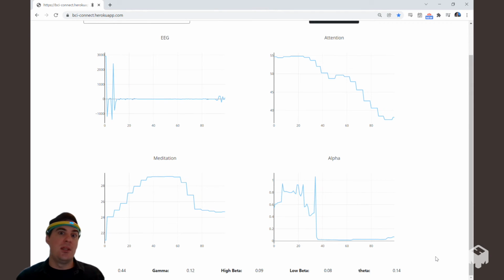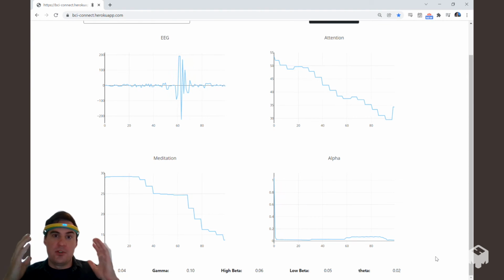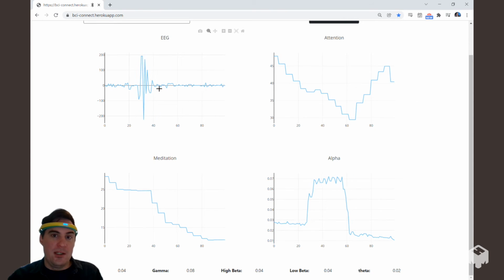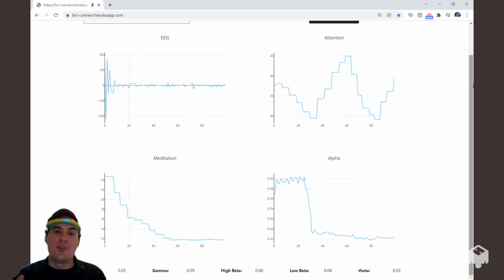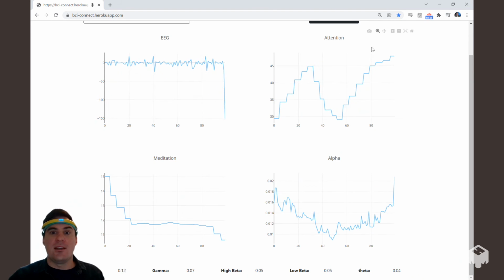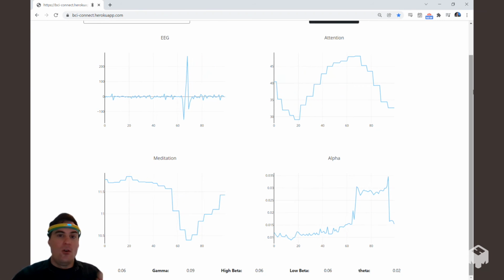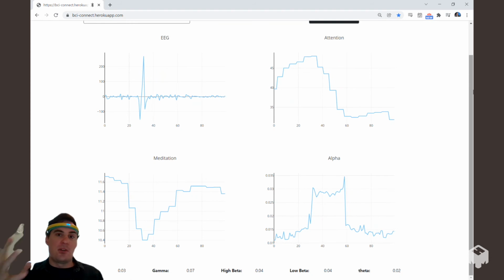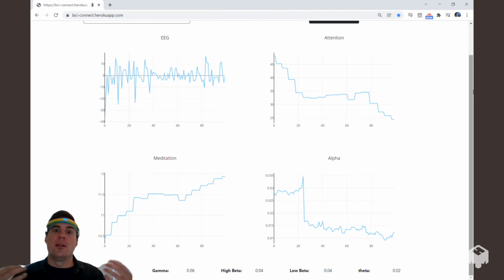Now, how do we take this and do something even more interesting? Well, if you understand how all of these different kinds of brain waves in your brain function, and you can find a way to read them using these small electrical signals coming from our EEG, we can actually create some really cool indexes to measure how engaged or how relaxed we are. So the last thing I'm going to show you with BCI on Chrome is this attention algorithm. What we've done on our end is our fancy scientists and engineers, we've taken all of this kind of data and we found out a scale that you can use to measure how engaged you are in something or how disengaged or relaxed you are.